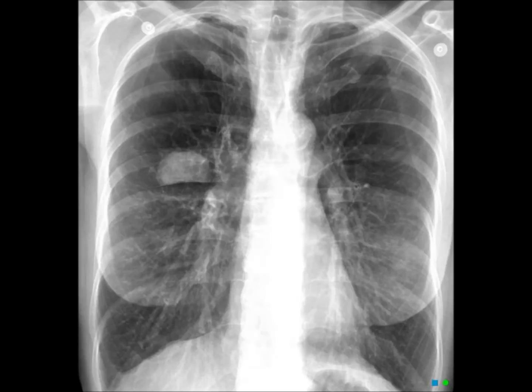details, and it's the same with examining a piece of imaging. Look at the whole thing. Can you immediately see any obvious abnormalities like a large lung mass? 5. Now we want to start looking at the details.